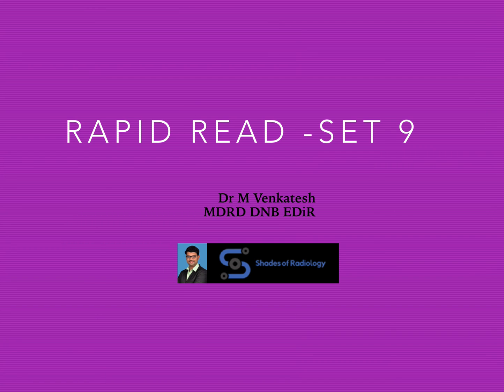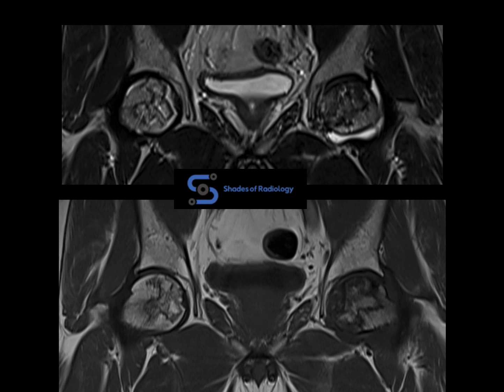Welcome back, everyone. Let us see the rapid read set 9, which includes both cross-section as well as conventional images. So let us see. Classic appearance, MRI, T1 and T2 weighted coronal images of hip joints.